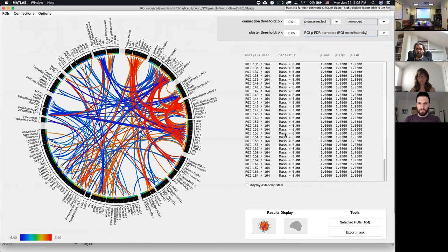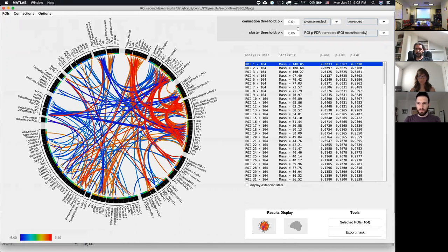High number of regions. I need to rewind a little bit. It's going to take a few minutes. Let's see.